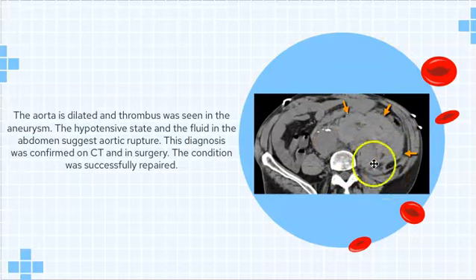Thank goodness. So here is just a CT of a ruptured aneurysm. Remember, if an aneurysm is ruptured, CT is the first line of defense. If we're just screening and following up an aorta aneurysm that hasn't ruptured, then sonography is usually the first line of defense.